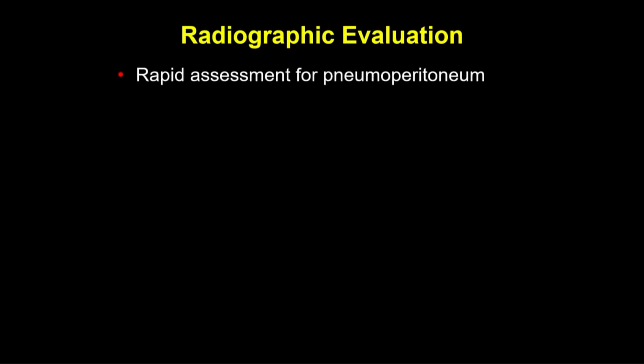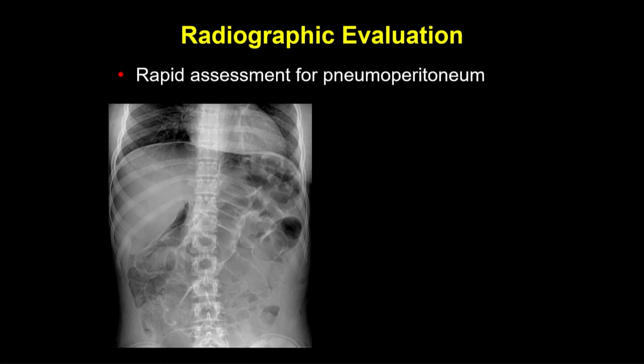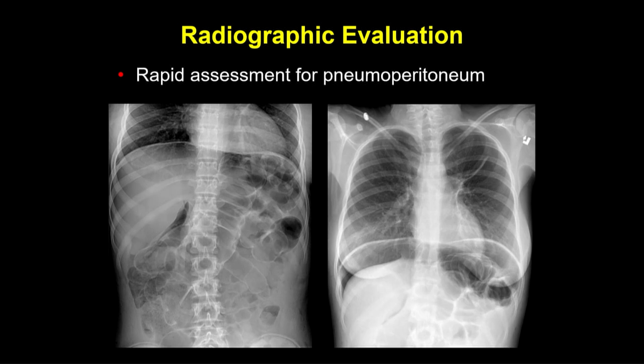All right, let's just start with the basics first. So radiographic evaluation, we know plain films or radiographs are great for pneumoperitoneum. Whenever I see a case, and this is the supine and upright companions here, whenever I see free air on an upright radiograph, as we see on the right, I always go back and look at the supine film just to see, would I have called it?